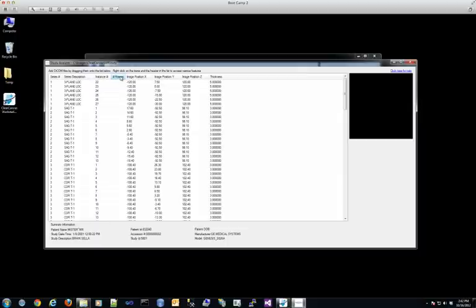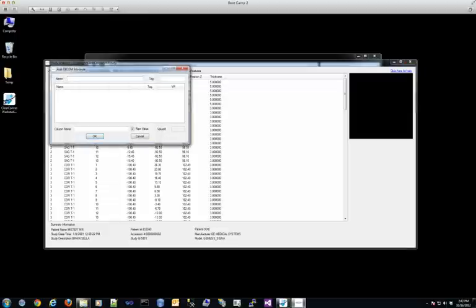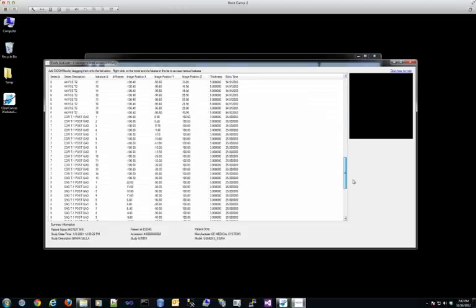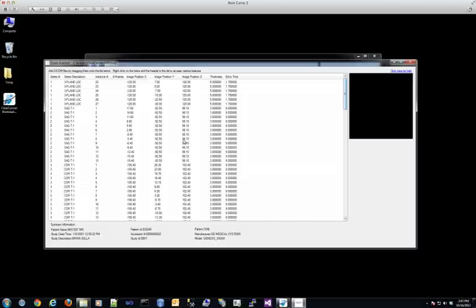And so I'm going to add a couple of the key attributes that are specific to MRI to the grid control. So by right-clicking on the header, I can choose Add DICOM Attribute. I'm going to go ahead and add the echo time to the grid control. And you'll see it automatically adds a new column and displays all the attributes there in a line. So I can make it really easy to look for specific series that have certain values, or even see how values, attributes change throughout images in the series.